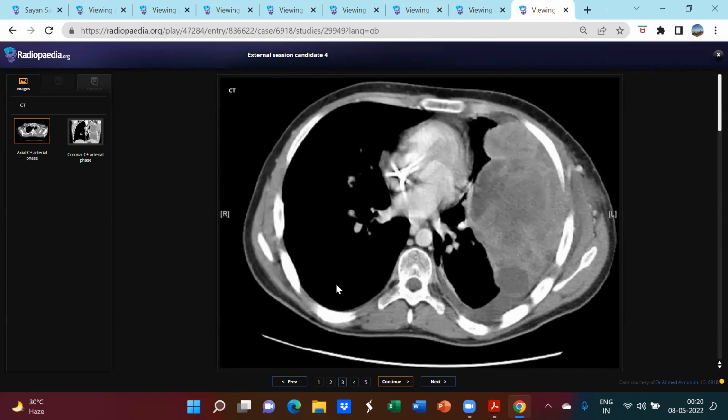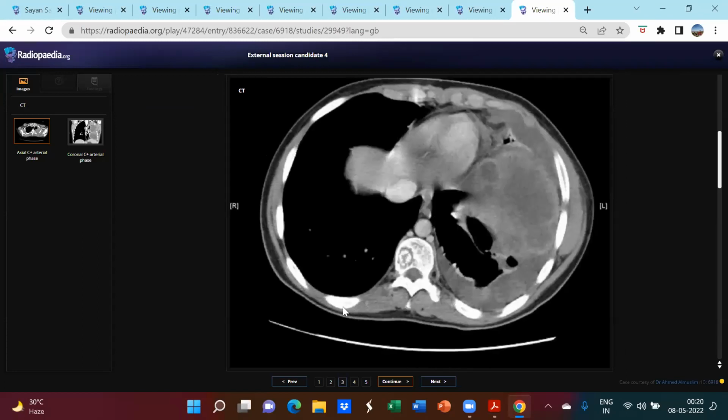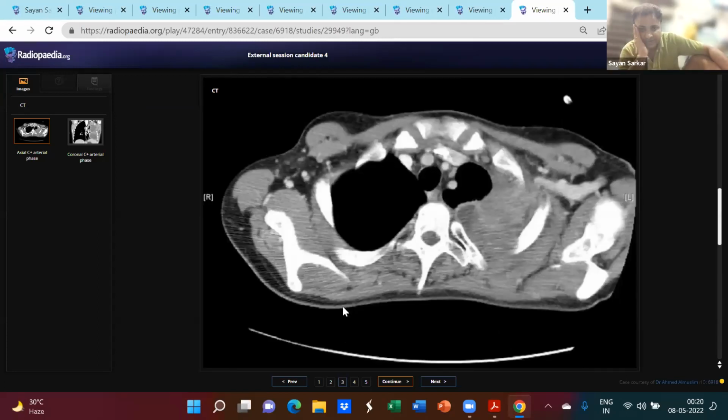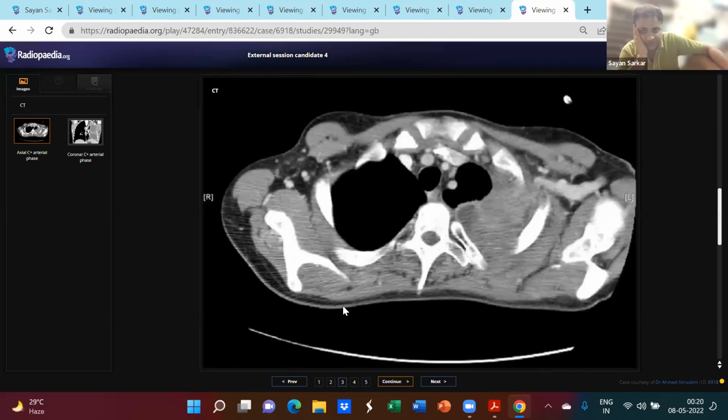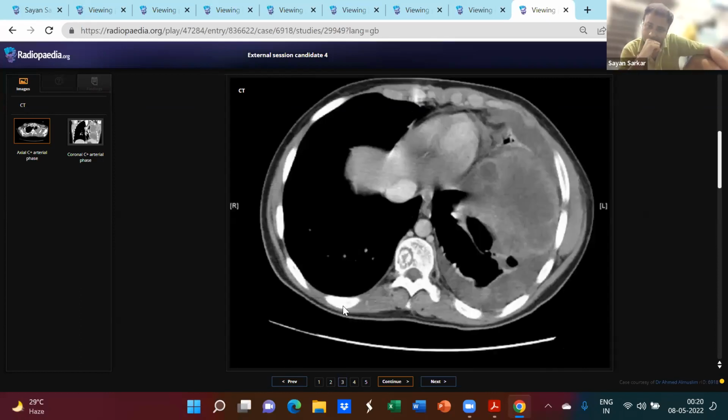Yeah, so as far as the primary lesions are concerned, mesothelioma in a young person. But yes, I was just talking about the DD, but in this patient it does not apply. You said chest wall, right? So what do you think can arise from chest wall? A rib lesion, like an Askin tumor.